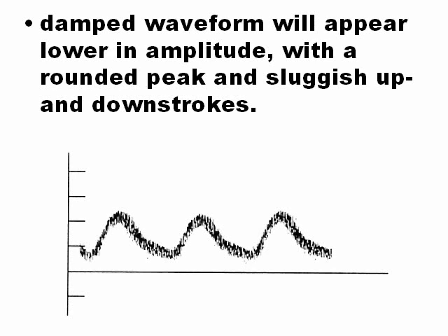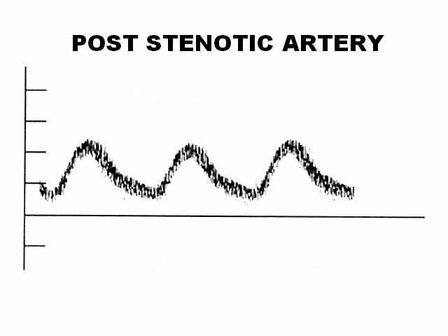After an obstruction, the artery loses the triphasic shape and becomes first biphasic and finally monophasic, and also the end diastolic flow becomes high because the arterioles of the muscle are always open, since there is low blood flow. Monophasic post-stenotic artery, or damped post-stenotic artery.